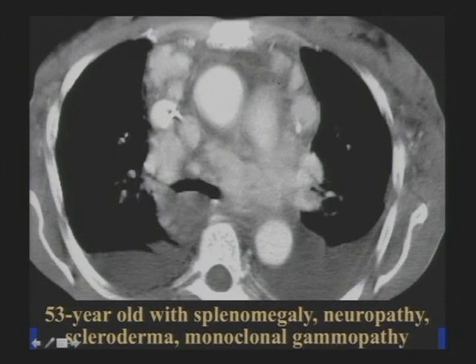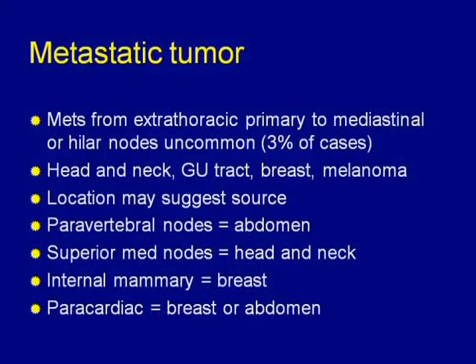But multiple enhancing mediastinal lymph nodes, I probably would have thought this was metastases. The patient had no known primary tumor. You would expect TB to necrose here. So Castleman's was another thought, and that's what this patient had, multicentric Castleman's disease. Okay, what about tumors in the middle mediastinum?